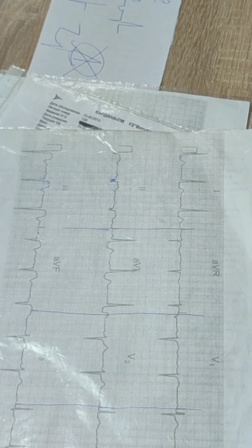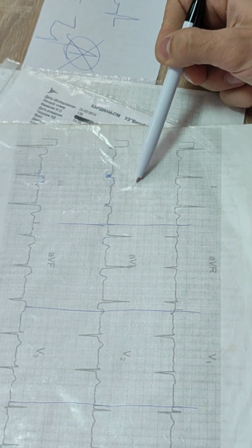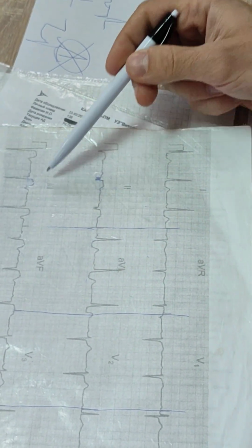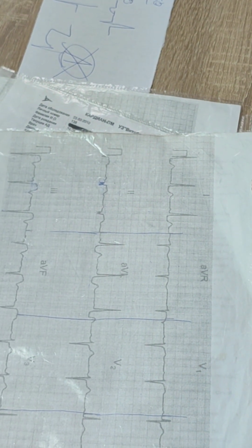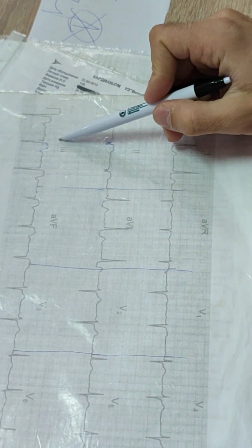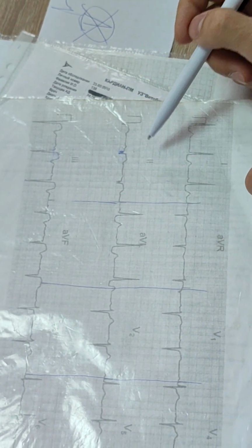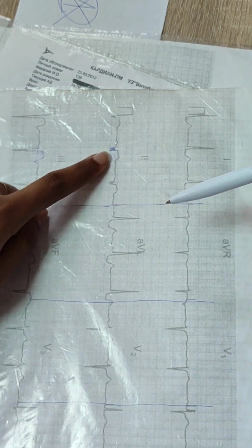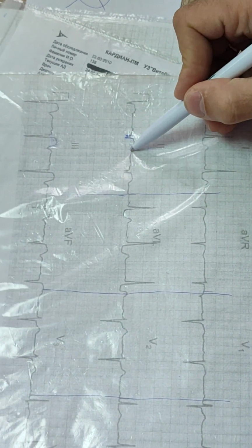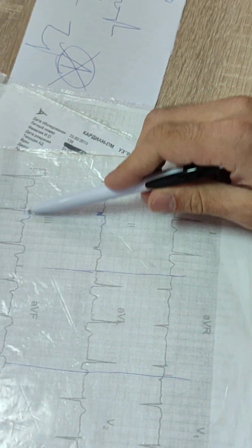Is it myocardial infarction or not? Yes, because of Q wave. Q waves are present in the second, third, and AVF. Are R waves present or not? In this lead, if R wave is absent even in one lead, it is transmural. So in this case, where is the R wave? Q is small, R is below the isoelectric line. It's like absence of R wave. So transmural.